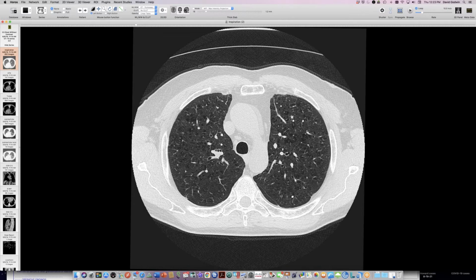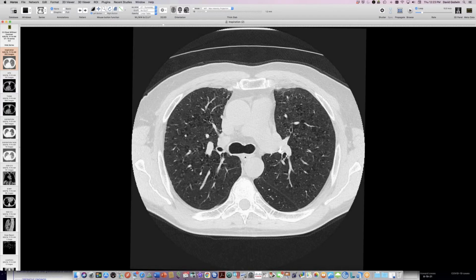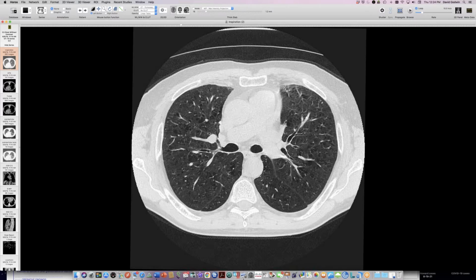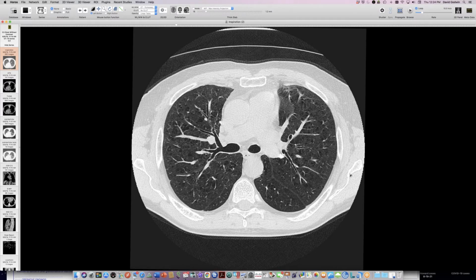Yeah, I think they had transbronchial biopsies. I don't think they actually got big pieces of lung that would show them the emphysema. And so they found dust in his lungs, and they found some reaction to the dust. And he also has emphysema. Now, one of the things that was not clarified in the clinical material I have was how much of a smoker he had been. So yeah, he has emphysema, I agree, but he also has dust in his lungs, and that probably is what's causing these little subpleural dots. So this is one of the patterns of silicosis that we see, or coal workers' pneumoconiosis, is small subpleural dots.